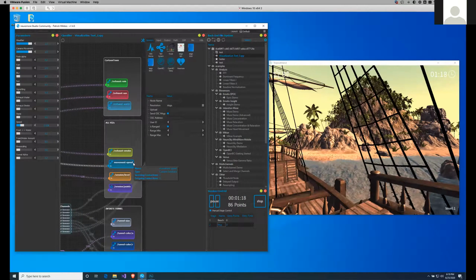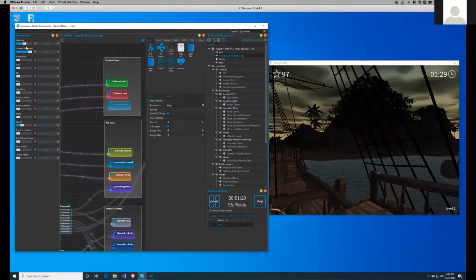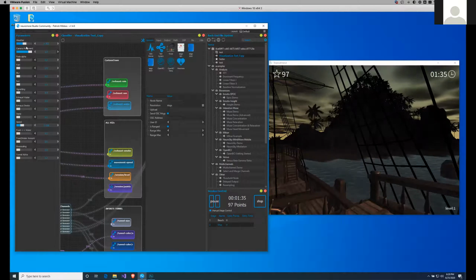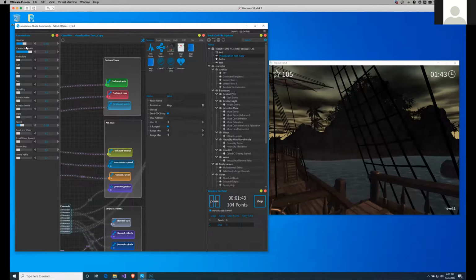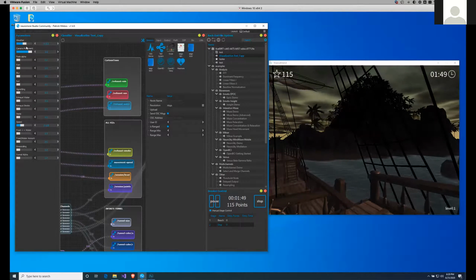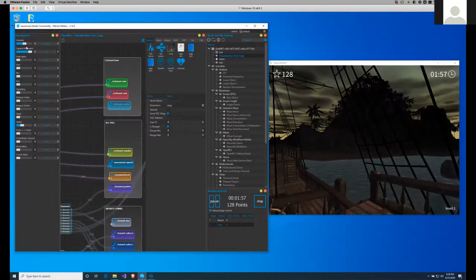A little side note, those visualizations currently are only available for Windows. We will work on making them available also for other operating systems. And what's also important to mention, those visualizations have been built using Unity, and we created a Unity prefab. And a Unity prefab is something like a library that you can plug into Unity, into either an existing Unity game or visualizations that you already have, or you can use it to create a new Unity visualization from scratch.